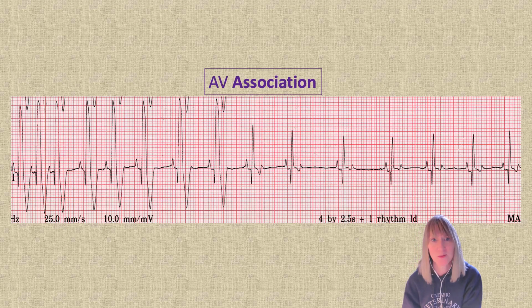So hopefully this helps you with this idea of AV association versus dissociation. We're going to use this concept in upcoming episodes to figure out some more rhythm diagnoses.